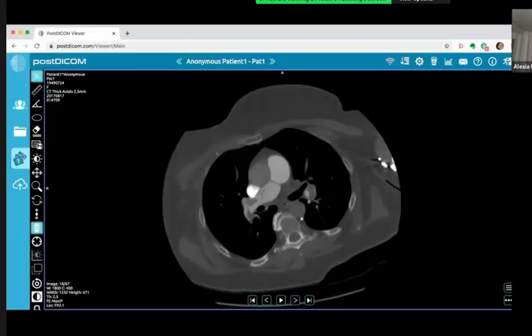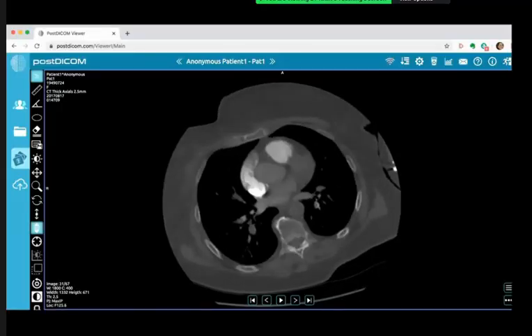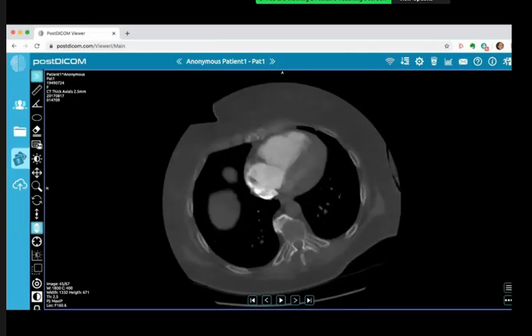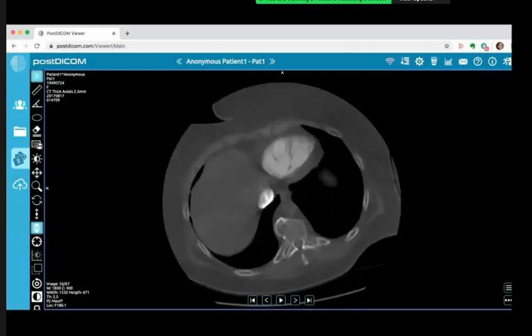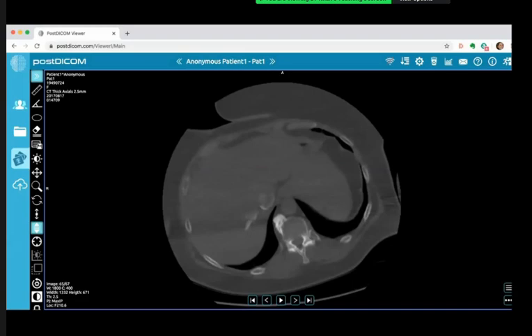And whenever you're ready. So these are axial CT slices of this patient's chest. This is a CTPA. It's windowed adequately to show the bilateral pulmonary emboli. I don't think I saw any saddle embolus in the MPA. I think that's the main diagnosis. I'll look through this on lung windows as well to look for any abnormalities. Those are filling defects, and the most likely thing would be pulmonary emboli.